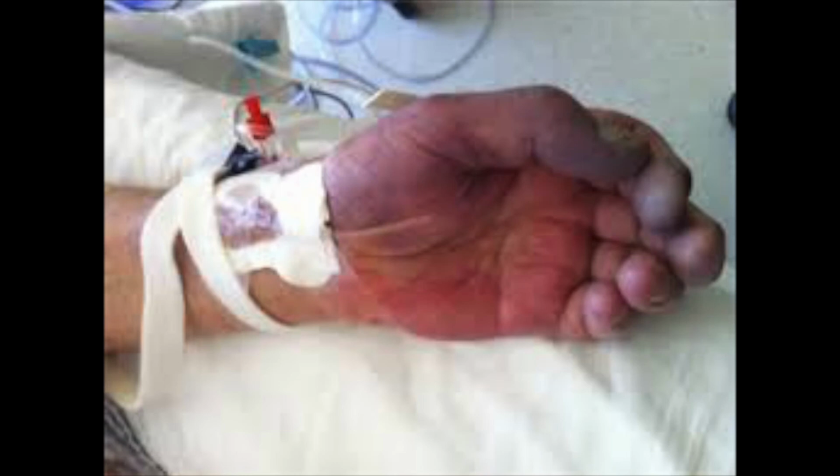Now the decision to insert an arterial catheter needs to be made with an understanding that it always carries defined risks such as bleeding, thrombosis, infection, distal perfusion compromise and emboli. If bleeding does occur, it's important to remember that direct pressure must be applied for a minimum of 5 minutes, as this is an arterial bleed. And in the presence of profound vasoconstriction, it's important to remember that femoral arterial blood pressure measurements are more accurate than radial artery measurements.